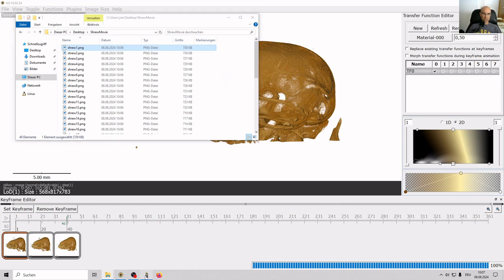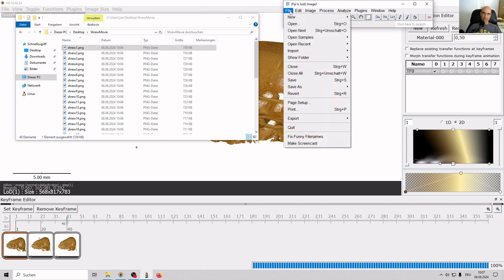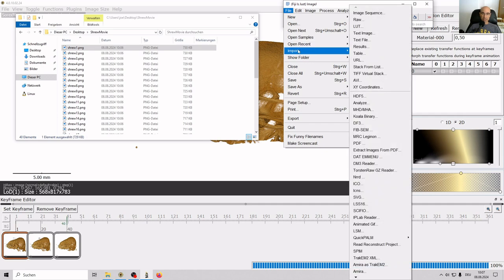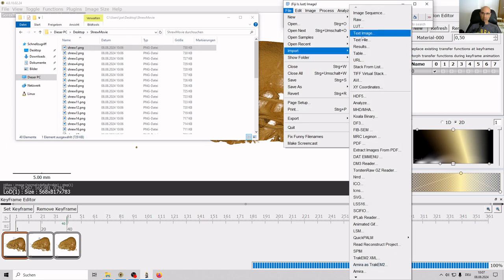Not that far, but the next part now is converting this set of individual images into something that you could upload to YouTube, for example. And for that, I'm going to use ImageJ. For some reason, I guess it's been Fiji is just ImageJ for a few years now, whatever. What I want to do in this case is import. So I left-click, File, Import. I'll put the link to this, another great open source program, been around for decades, ImageJ. I'll put the link in the chat window.